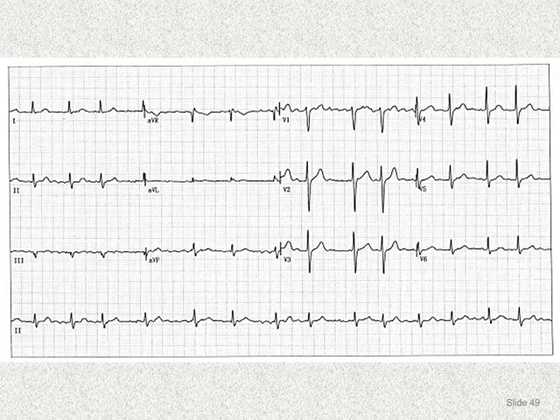and this leads to we cannot say there is a P wave. So this is not a P wave. This is a fibrillatory wave. So we have irregularity and no P waves. As you see here, no P waves. This is fibrillatory waves, usually coarse or fine, seen in V1. As you see here, this is coarse fibrillation. It's very easy here. So this is atrial fibrillation.